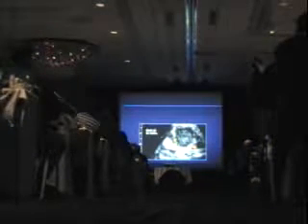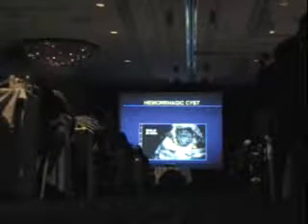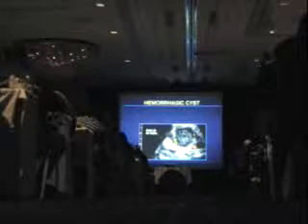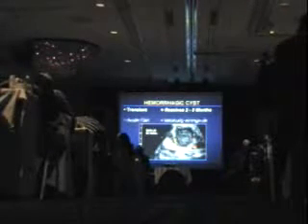Now what about this? That doesn't look the same as the endometrioma that I showed you. Although it is avascular, it's much more heterogeneous. And of course the history helps too. This woman came in with acute pelvic pain and she was mid-cycle, and I think you would suggest at that point, because it's avascular, that this is probably a hemorrhagic cyst with the acute episode of pain. We know that these are transient, so if you can follow these for a few months, it should go away.